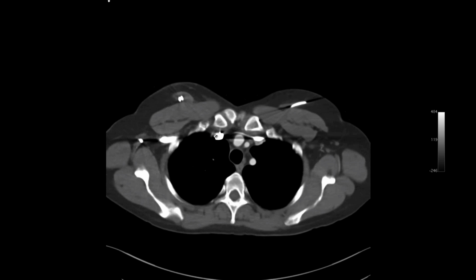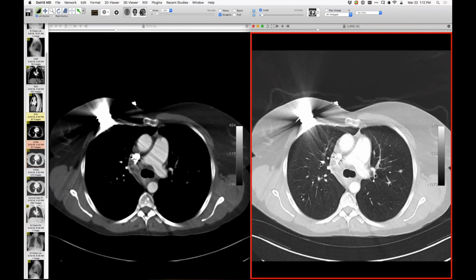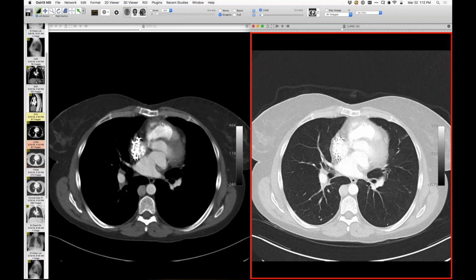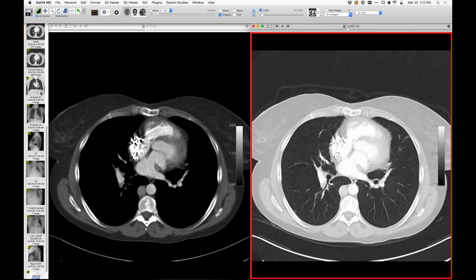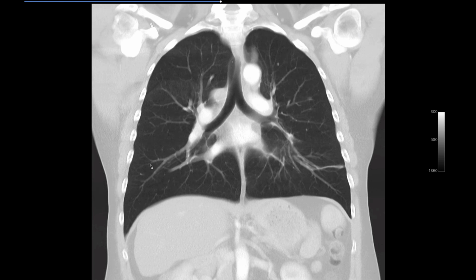But we do have an azygos vein over there, as you see there. And then I started thinking of Kanne's rule that says if you see vascular abnormalities, you've got to look for other things. And if you look at the lobation, you can see one bronchus on the right, but another bronchus, but really only two bronchi. So that is actually shown really nicely here, which is a nice way to teach and depict bilateral hyparterial bronchi.